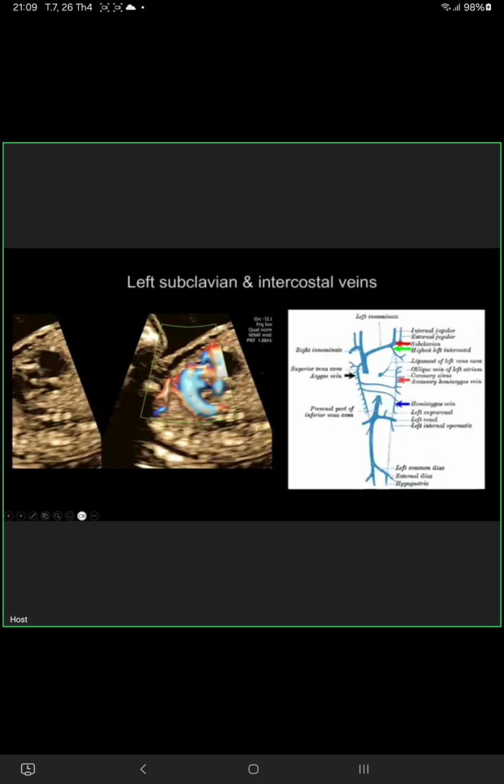They prepared an operating room for the possibility of something with the aorta, but nothing. So it's an example of a normal baby with early appearance of asymmetric four-chamber with an additional vessel to the right side.